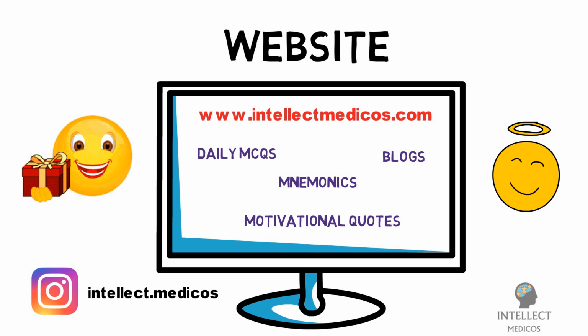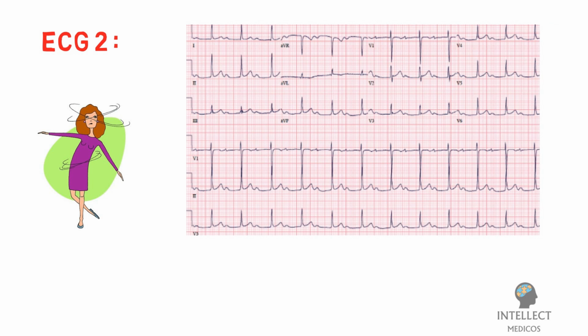Now without wasting any more time, let's move to our second ECG problem. Question number 2. A 35-year-old woman comes to emergency with complaints of dizziness. What is the abnormality shown in this ECG? Now again, pause this video for a while and try to interpret this ECG step by step as explained in my first ECG video. This is a very easy example.